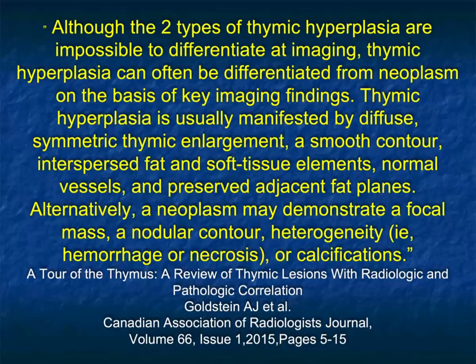And again, think about all of these factors, and I give you some references here. But again, the things we think about in the thymus: the density, water density, vascular, is it fat infiltration without significant enhancement? Is there calcification or not?